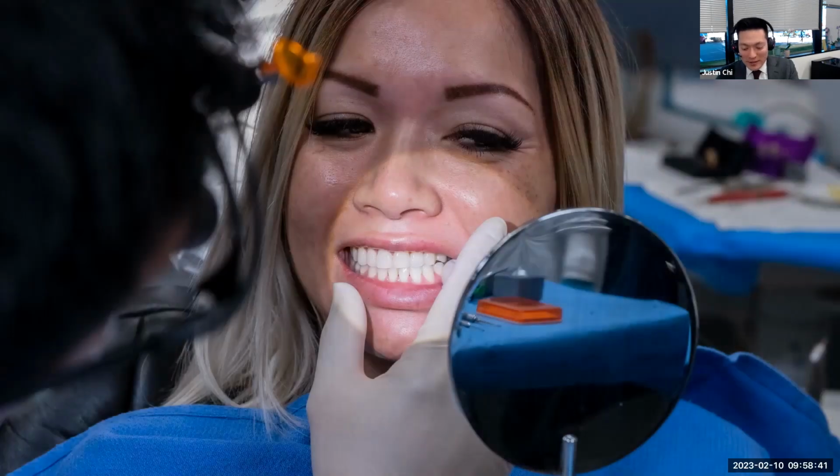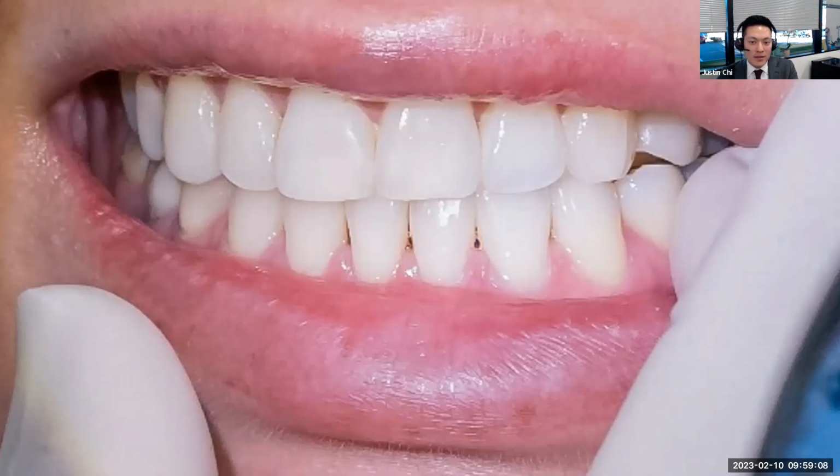But when we went to show the patient, you can kind of tell from her eyes, she's not loving it. And what she is seeing with this case is the space on that mesial cusp slope on the buccal. You see the little gap there, that dark space between that mesial occlusal embrasure and the opposing. She wants that area closed. So even though we've made a more anatomical form of that premolar, because of the positioning of her teeth post-ortho and missing premolars, this is an occlusal black triangle that she really wasn't too happy with.